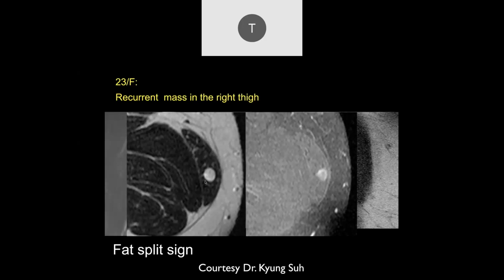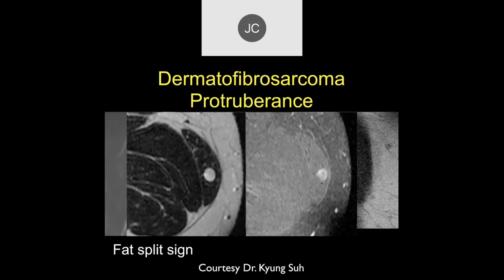And you can actually see nerve sheath tumors in muscle like this. It's pretty uncommon, but I've certainly seen that. And that would be my first choice here as well. But this turned out to be a dermatofibrosarcoma.